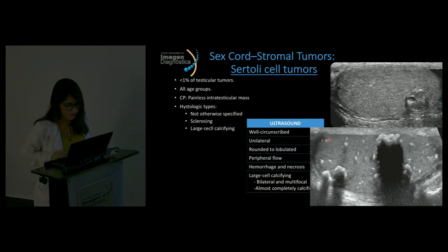So, for example, this is a longitudinal scan of a multifocal large cell calcifying Sertoli cell tumor, showing calcifications with acoustic shadowing.